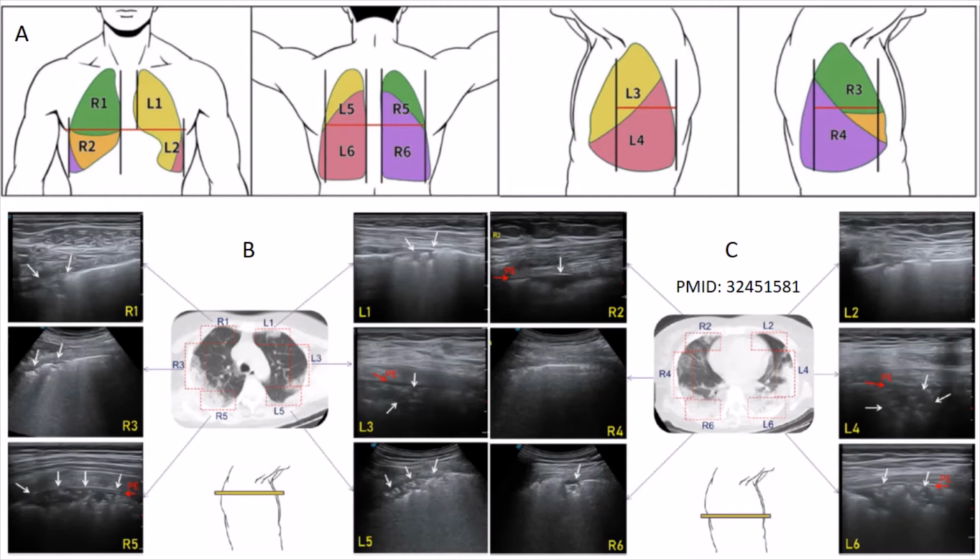Panel C shows ultrasonography of the lower lungs. Multiple B lines and abnormal pleural lines are shown in all regions. Consolidations or consolidations with air bronchogram can be seen in R2, L4, R6, and L6. Extremely little pleural effusion can be seen in R2, L4, and L6.